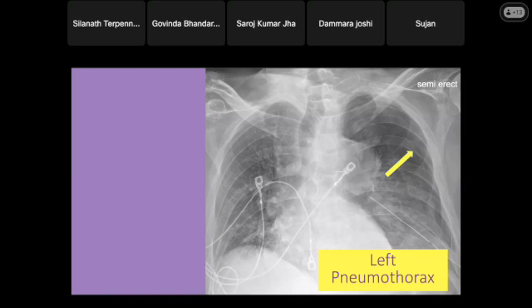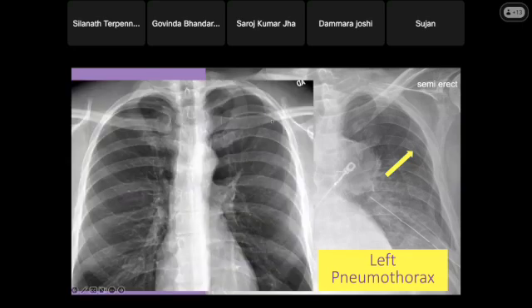They may, if this pneumothorax is bigger than yesterday, adjust the chest tube a little bit. That's it. That's all that they're going to do. So we did not make a phone call here because it's expected with the chest tube in place. And look at this. See that? You don't see any pleural line here, but you do see it here. So that is the place that you look for pneumothorax. You look for the pleural line.